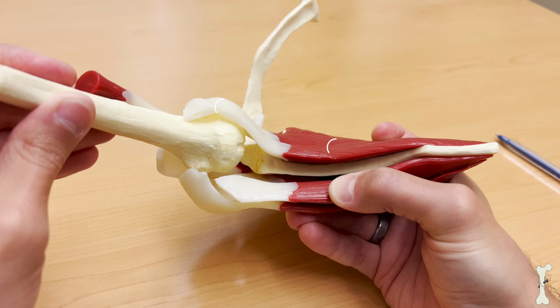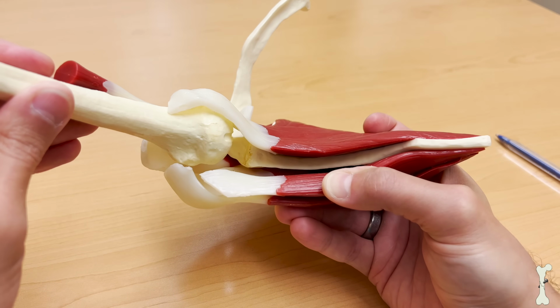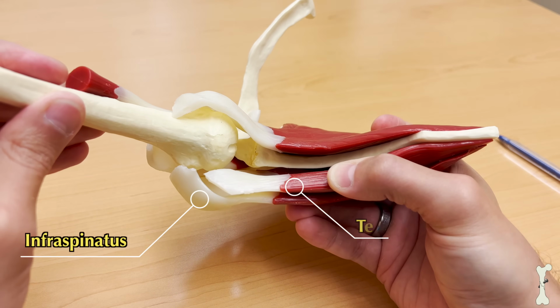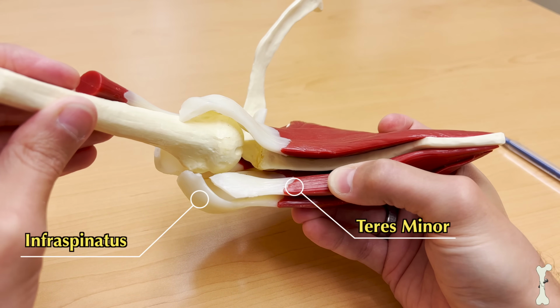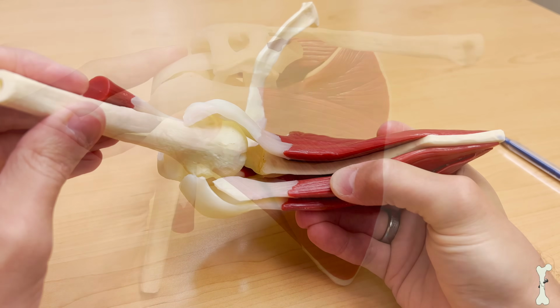The posterior aspect of the shoulder blade is the attachment point for the infraspinatus and the teres minor, and we can see those muscles, and those muscles and tendons extend out laterally towards the humeral head and attach to the posterior aspect of the humeral head.